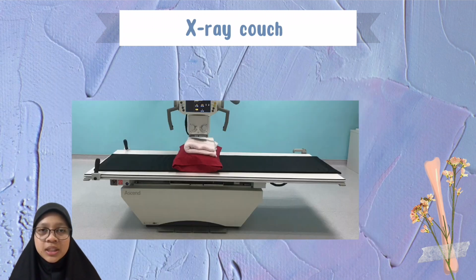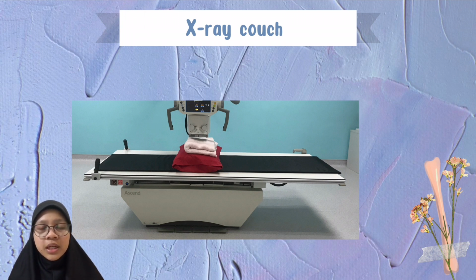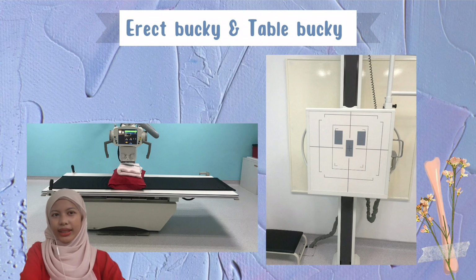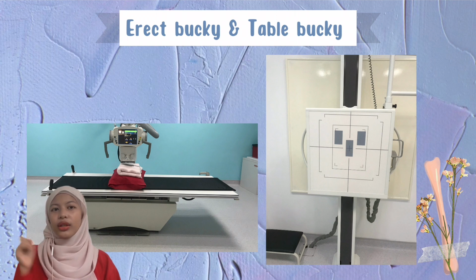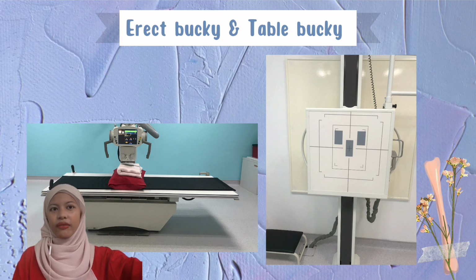Moving to the X-ray couch. The X-ray couch, also known as the patient table, is the platform where the patient lies during the procedure. Other than that, the X-ray couch can be moved upward and downward, also outward and inward, by stepping on the pedals. So what is the function of the erect bucky and table bucky? Of course, they will hold the cassette or IP plate. Also, there are parts that will support the patient's position and give comfort.